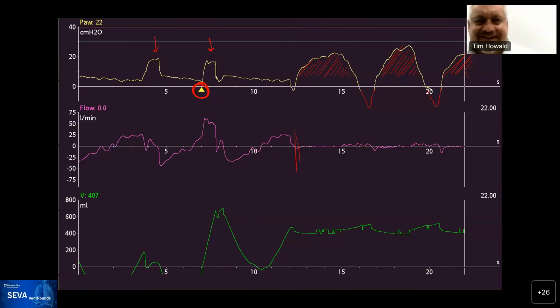It's kind of catching the patient off guard, so they activate the muscle and go through the whole effort, but now with the valve closed, and you capture that, and then you release, and they continue to breathe. As time goes forward and you're breathing against a closed valve, that changes the pressure dynamics. So the first occlusion is the one that matters for this group of patients.